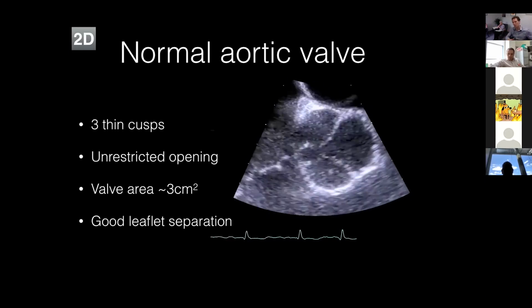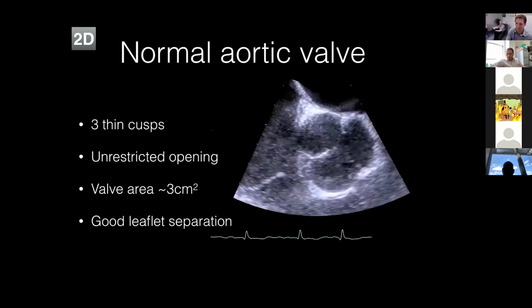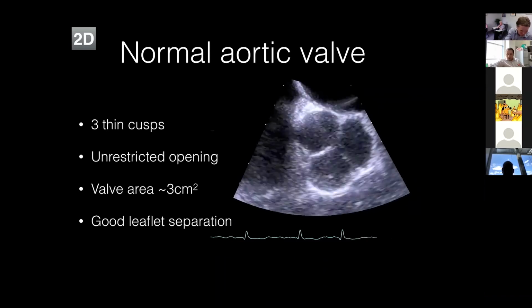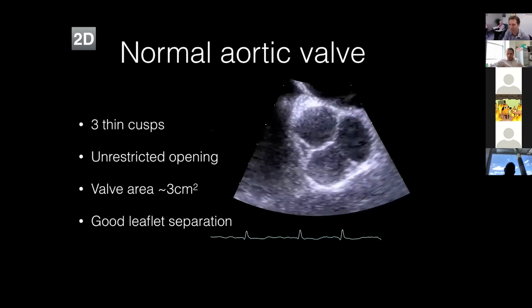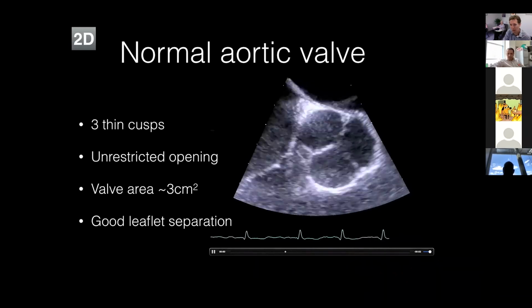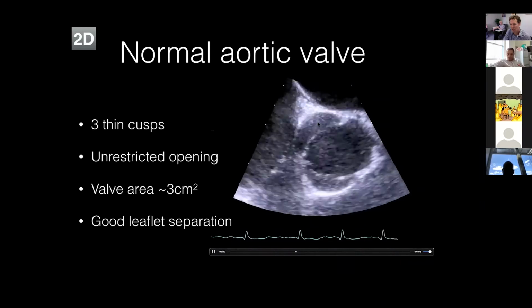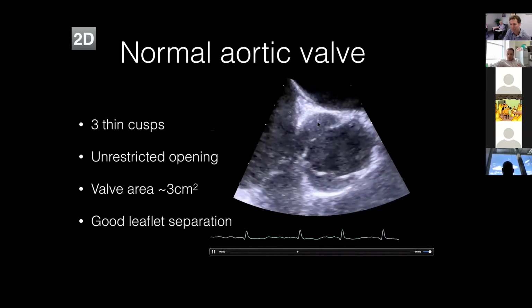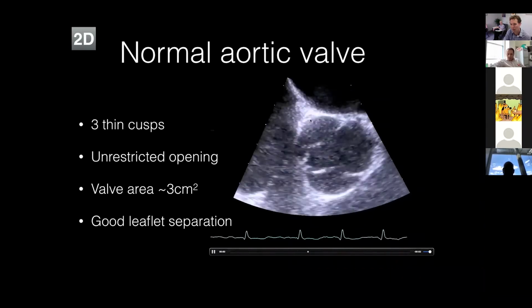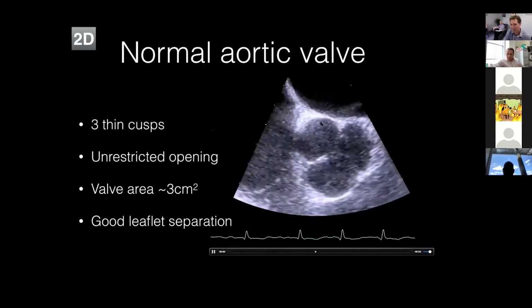Hatton, can I ask you a question? Can you see the aortic valve I've got there? Can you tell me, is that a TTE or a TOE image? A TOE image. Very nice, because we've got that wibbly bit up the top. The septum. Fantastic, it's the intraatrial septum. So that cusp is going to be which? That would be the right coronary cusp. Sorry, I'm pointing at the one next door to the intraatrial septum. So that would be the non-coronary cusp.